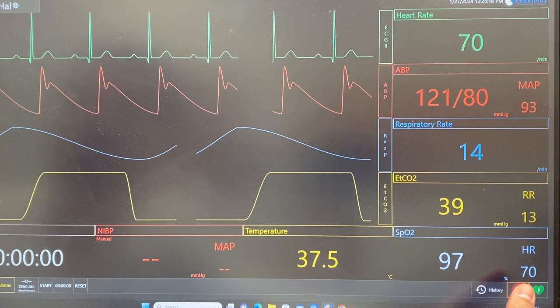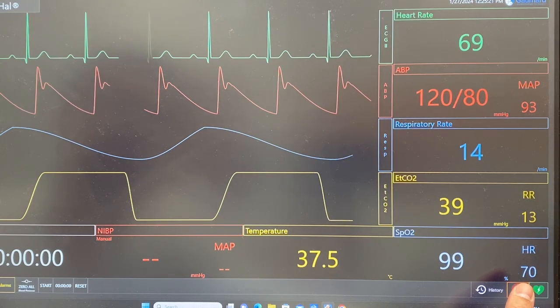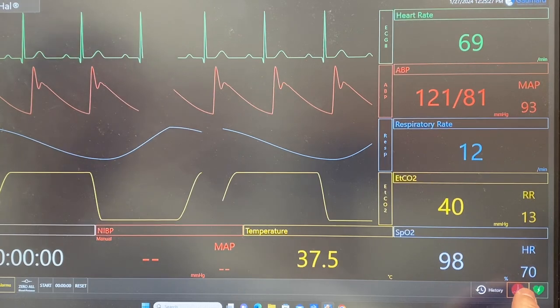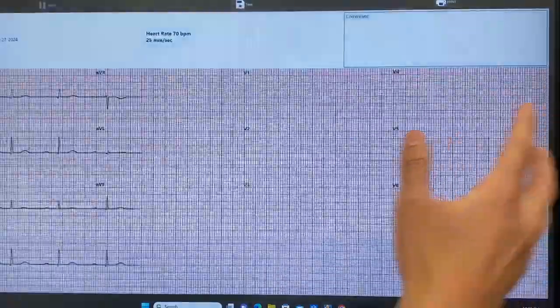This actually will be useful because we're going to be on a 4th med card. And you'll be the consultant for the whole class. I'm not going to say anything. Okay, I see irregularity already.